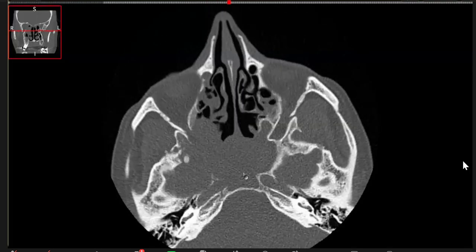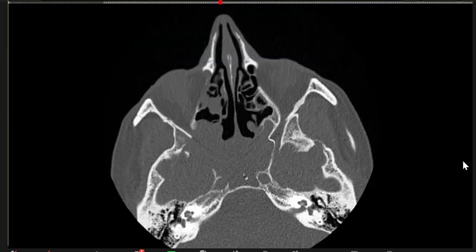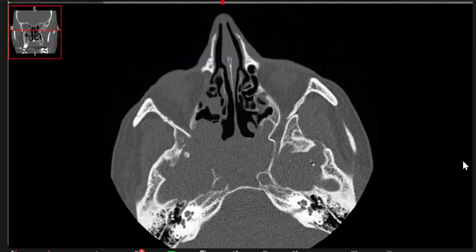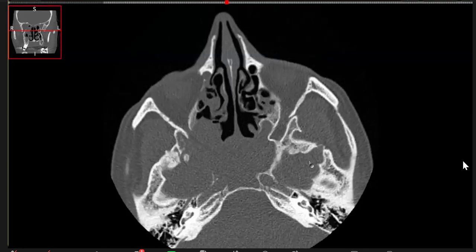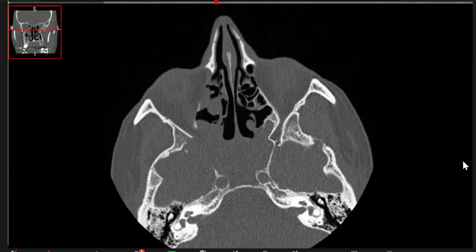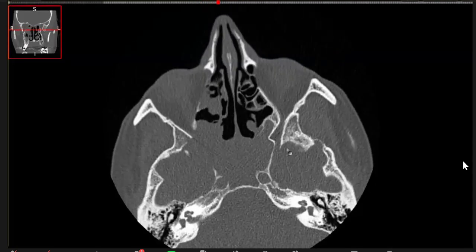The candidate did very well, pointing out that the lesion is going into the pterygopalatine fossa. But please remember in the exam, they are not going to be satisfied just with this word, because they are going to go into details of what is happening. Because everything was destroyed here, the viva went into normal anatomy, and this will happen in the exam. Many a time they will ask you normal anatomy.